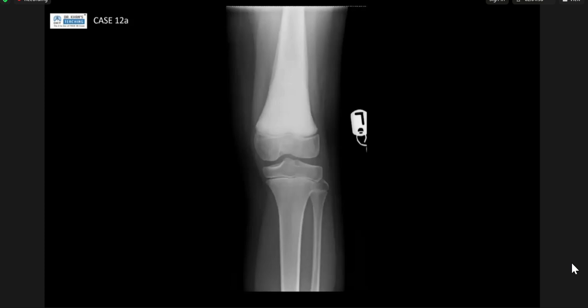So I'm given a frontal radiograph of the knee joint with distal femur and proximal tibia visualized in a skeletally immature patient, and I can see generalized sclerosis of the distal femur metadiaphyseal region with a band-like lucency running beneath the cortex, and the sclerosis of the femur in the diaphyseal region, and the rest of the epiphysis and tibia and fibula appear normal.